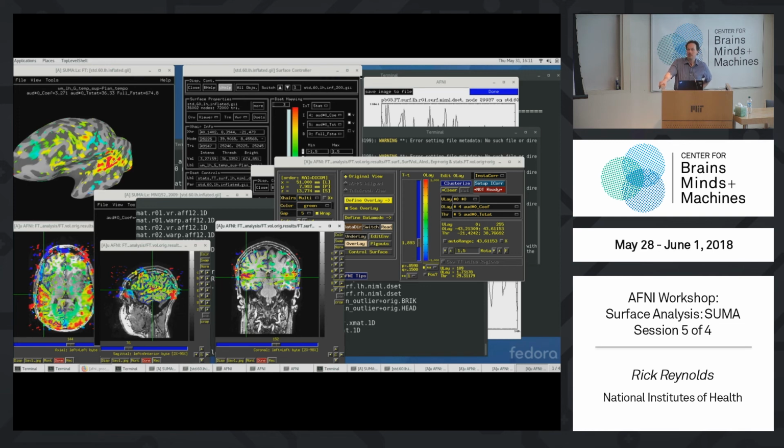If you have motion artifacts, what does a motion artifact look like in the volume? Many of you may have not seen it. It would be a statistically significant looking result that just follows the contour of the cortex. It doesn't really care where it is in the brain, it's just following the cortex.